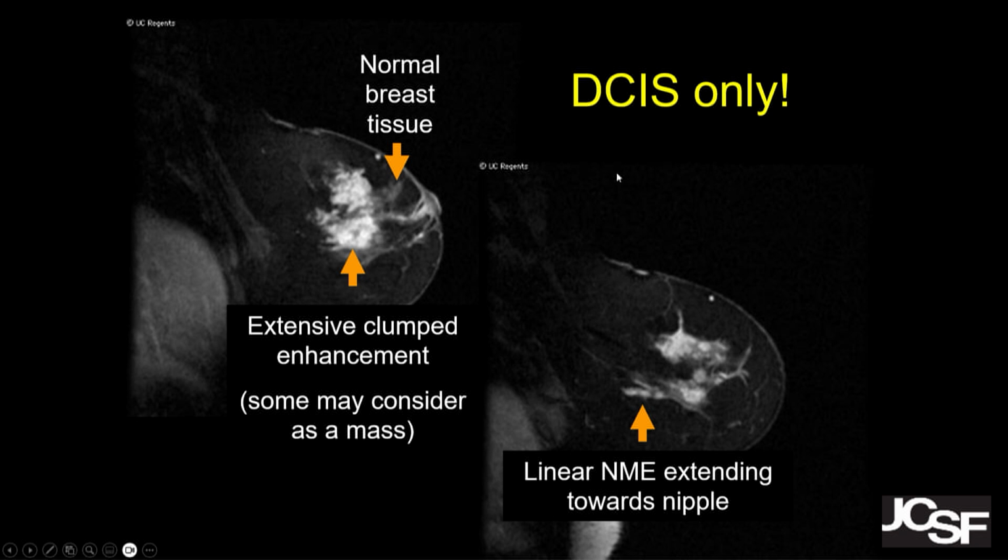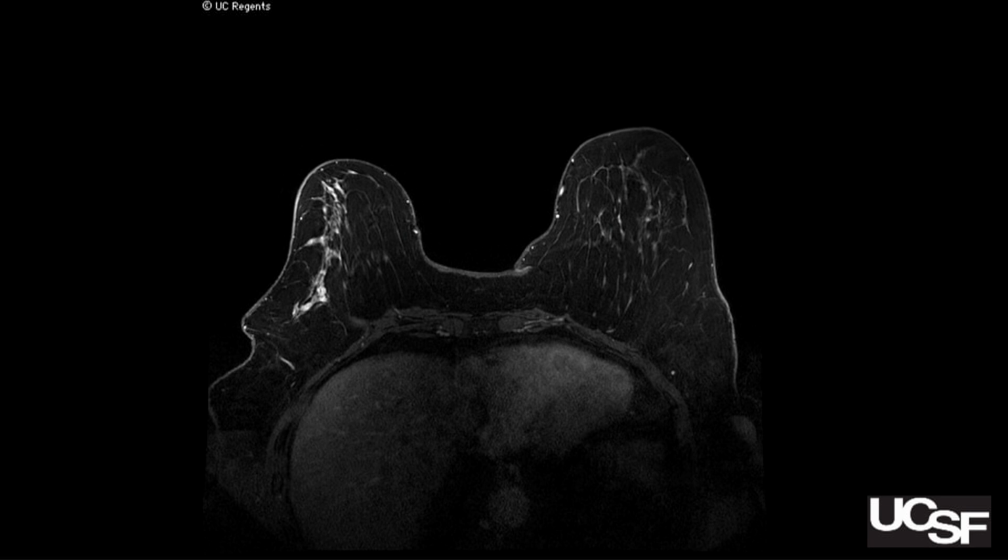We did this MR back in the old days, hoping or just making sure we don't miss invasive cancer. And so, a nice biopsy in the middle of this would be all you need to do your best at excluding invasive disease. Okay, case 5, newly diagnosed cancer. So this is that parade of complicated MRs, and you're thinking, where are the high-risk screeners? I want a screening case. Not the best positioned MR, but there you have it.